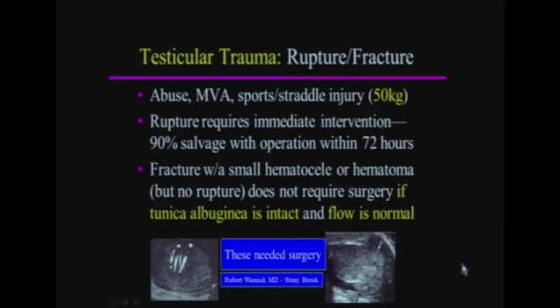These two individuals needed surgery. The individual on your left shows flow only to a portion of the testicle. That person had irregular testicular shape, border, which is part of what I just showed you. And then the individual on your right, this testicle on the right, you can see that the testicle is a normal shape, except at the bottom of it where it blows out here.